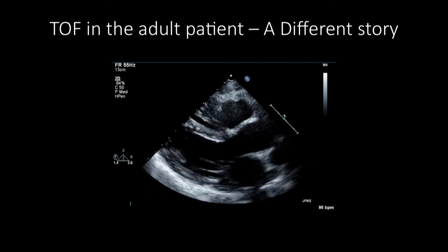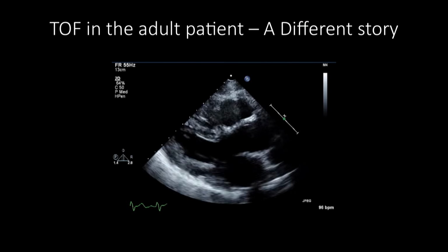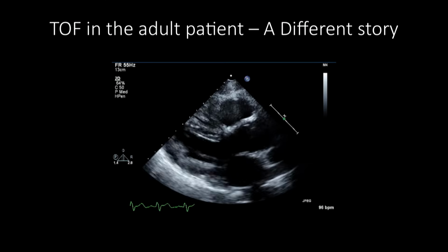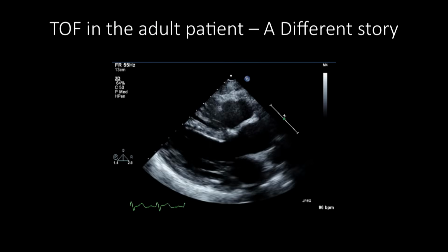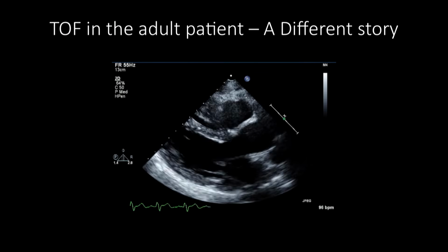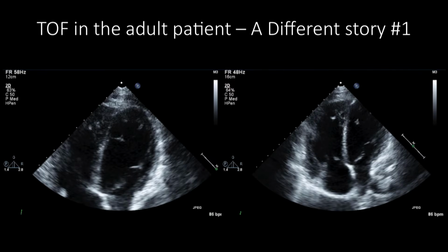Okay. We can also see that the aorta is not completely aligned to the LVOT. It's not perfectly aligned because this was an overriding aorta that we patched, and a lot of times we can see that the LVOT doesn't have a normal morphology as a result. We can also look at the RV, it looks thicker than normal and larger than normal. So this one image is already suspicious for tetralogy of Fallot. And the reason I point all this out is because sometimes you'll get these patients without a diagnosis. So it's important to recognize these features.